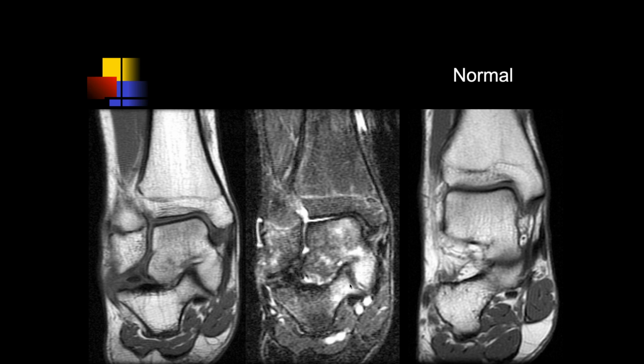And there are a lot of little anomalies like this that can occur in the ankle area. I don't think, well, maybe it's possible, but I'm not sure they've all been exactly categorized. But you just have to look at it. When you see a lot of edema and so forth, then you have to try to figure out what the mechanism is and look at the anatomy. And if it's an abnormal anatomy, then that may be a congenital reason for the problem, especially in younger individuals.